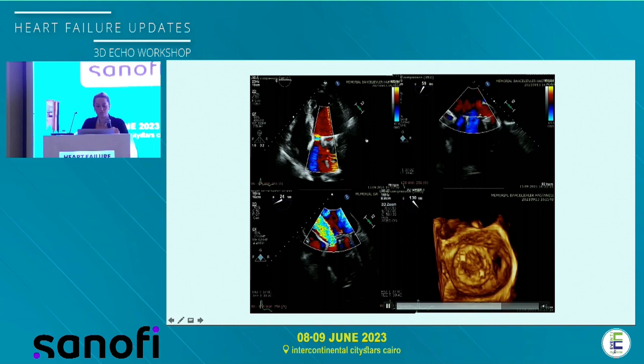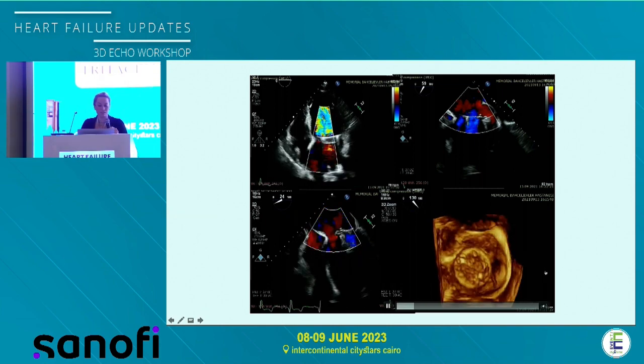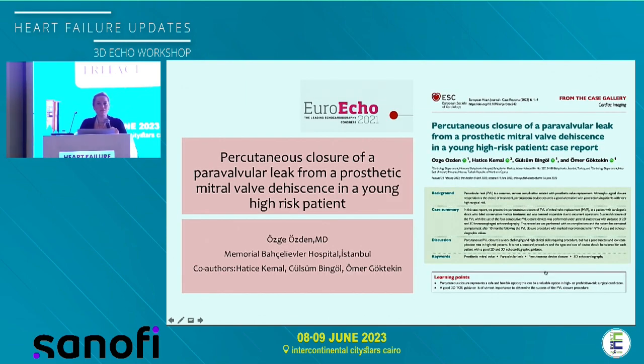And this was another case. You see the transthoracic echocardiography, it's a medial defect, at 3 o'clock position. I showed this case before, just wanted to show one more example. And this was a very interesting case. We presented it at EuroEcho, and it was also published in European Heart Journal Case Reports.